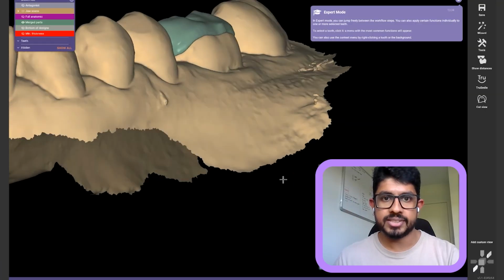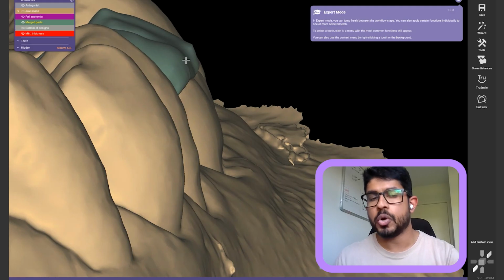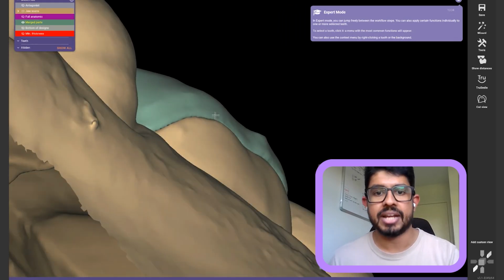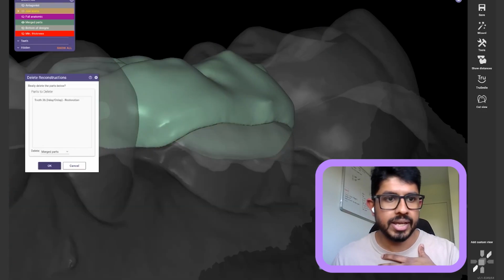So we've got our onlay design over here. You see that overhang margin there again. You don't have a flush margin, which you will see quite vividly when you go ahead and bond this in. So you want to make sure that you don't have that. So again, I have to first delete the restoration that was designed. I'll go ahead and click delete.